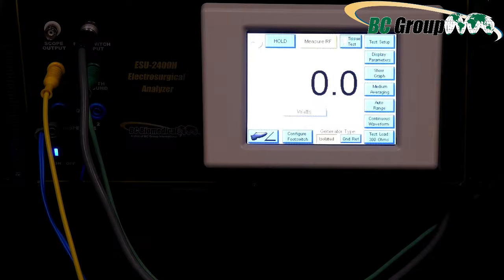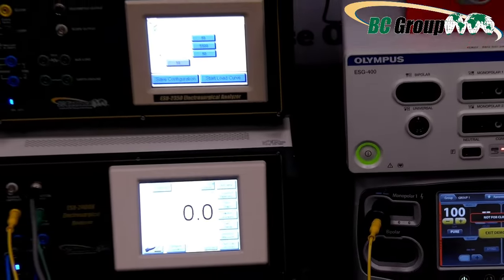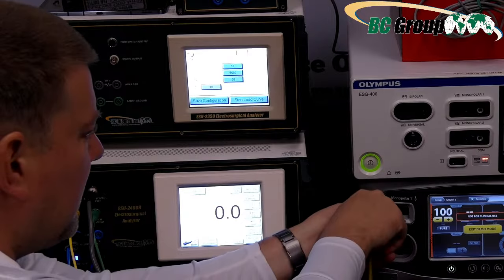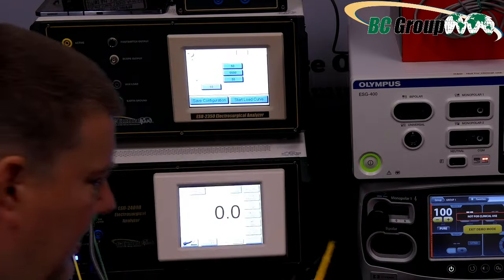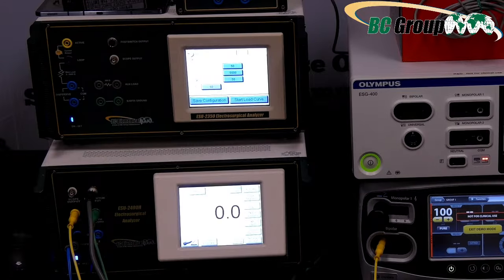And to do that, let's update the PTZ. Okay. For the bipolar, we are going to use 2 cables. So now we need this guy right here, this dingle hopper, and we need another one. Okay, so this one here, I'm going to place down here.